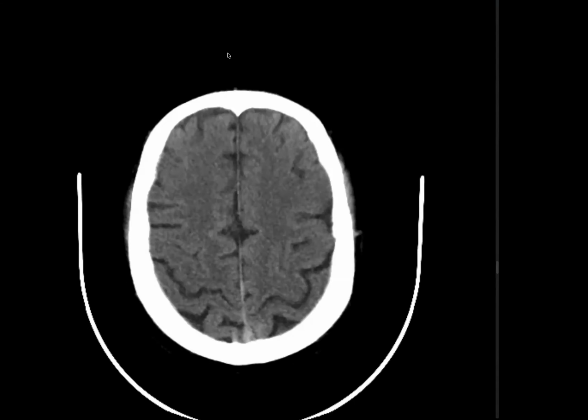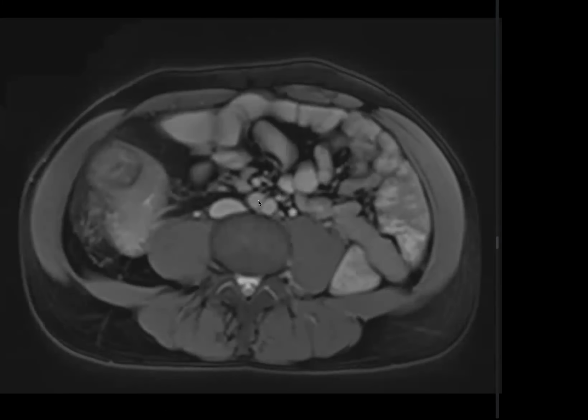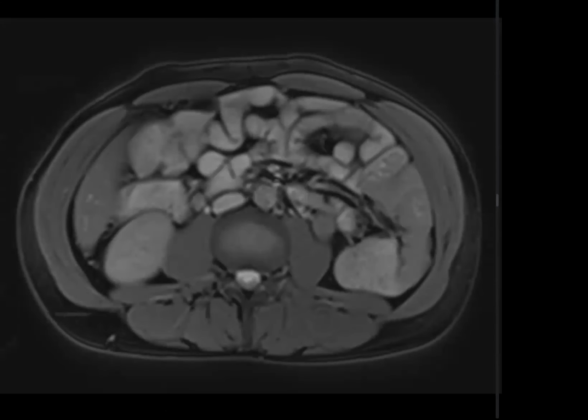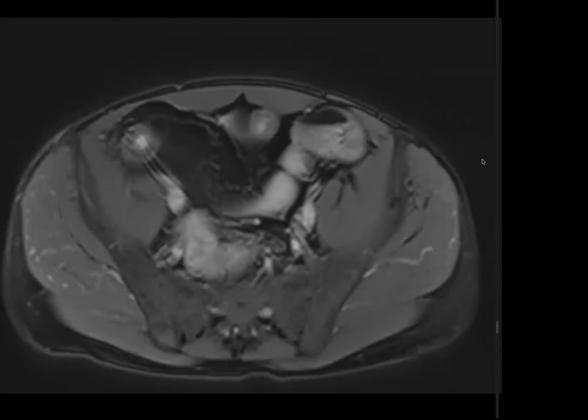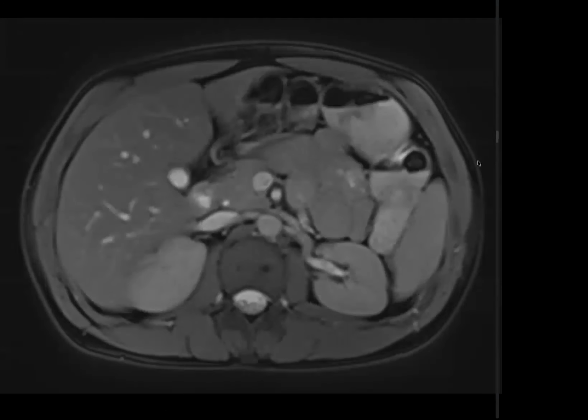So the first patient is this one, and the history is this is a 34-year-old lady with chronic abdominal pain for a long time. She's known to the hospital and has presented acutely. What do you think? Sir, chronic abdominal pain and presented acutely to the hospital.